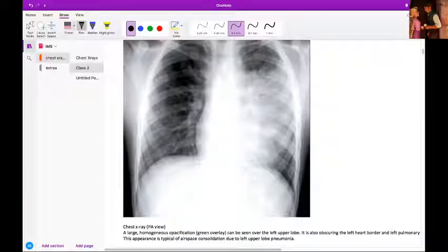No, no. Just the diaphragm is the lower lobe. On the left side, the left paratracheal stripe and the left heart border, both of these are in the upper lobe. Okay, this is mainly the lingular portion, and the left lower lobe is only the diaphragm. Even on the right side, the right diaphragm is the right lower lobe. All right.